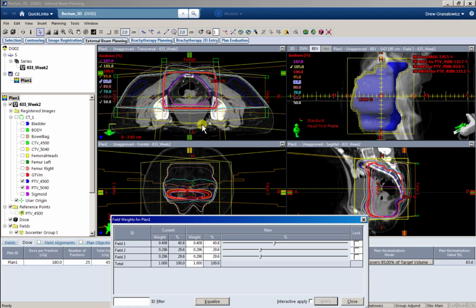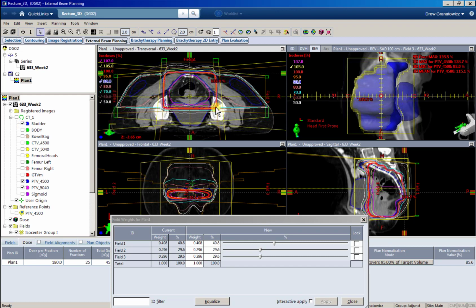And then you'll have dose constraints usually that you're going to worry about. But for these 3D pelvis cases, a lot of times your OAR doses are just going to be dependent on what your PTV looks like and your block. So for example, if we're not meeting our bladder constraint, we likely would need to edit our block, which would be a conversation to have with the doctor, okay?